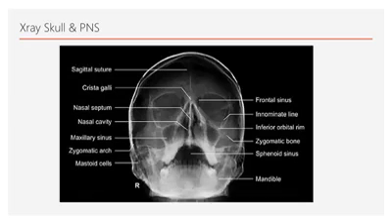So this is the X-ray of the skull and paranasal sinus. When we see the X-ray, we will say that this is the plain X-ray of skull with paranasal sinus, occipitomental view. And this X-ray is showing the frontal sinus, the orbital cavity, the oral cavity, the maxillary sinus, and alveoli with sockets for root of the teeth. We can also see in this X-ray the mandible rami and temporomandibular joint.